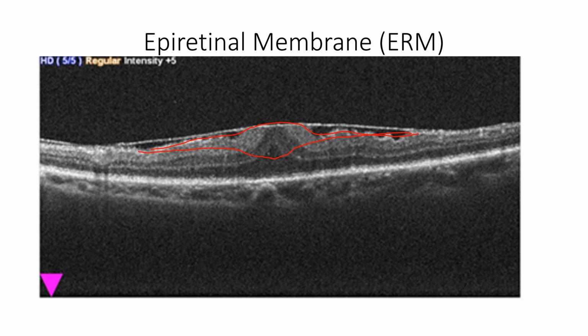So this is what an epiretinal membrane will look like, as a distinct membrane overlaying the surface of the retina and causing distortion. And this distortion is a sign that this patient needs intervention, because this will contribute to diminution of vision and distortion of vision.